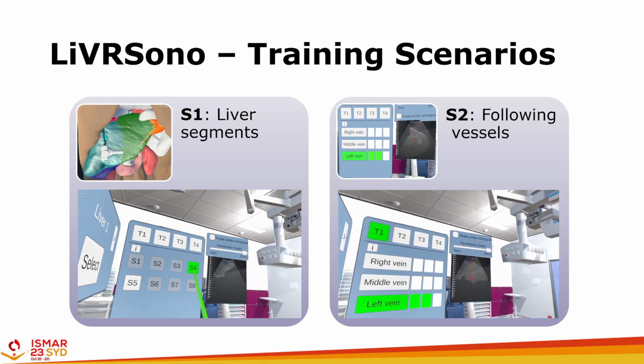It's quite difficult to see, but there's a small horizontal vein the user is currently tracing.